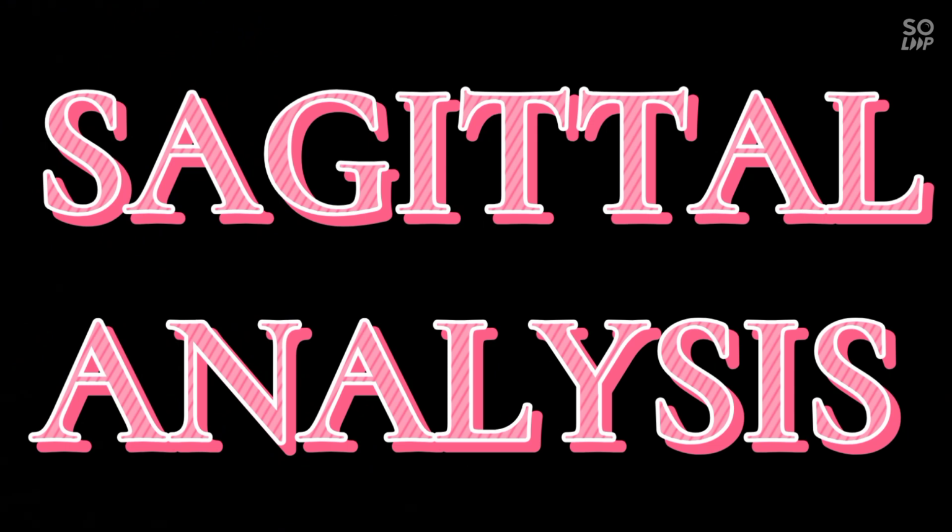Our today's topic is sagittal analysis of cephalometry. The sagittal analysis is also known as the anterior-posterior analysis, in which we deal with the anterior-posterior relationship of the jaws, like which class the jaws are in: class 1, class 2 or class 3.